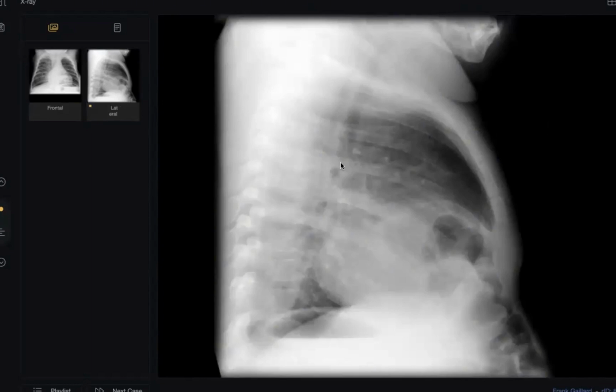On the lateral radiograph, I can appreciate that there is an air lucency noted anterior to the heart. This is communicating with the abdominal gas shadows, and this is likely a small diaphragmatic defect through which part of the colon seems to be herniating into the chest. It's anteriorly located. So this is a diaphragmatic hernia along with a small right upper lobe patch of consolidation, which may be secondary to an infective etiology.